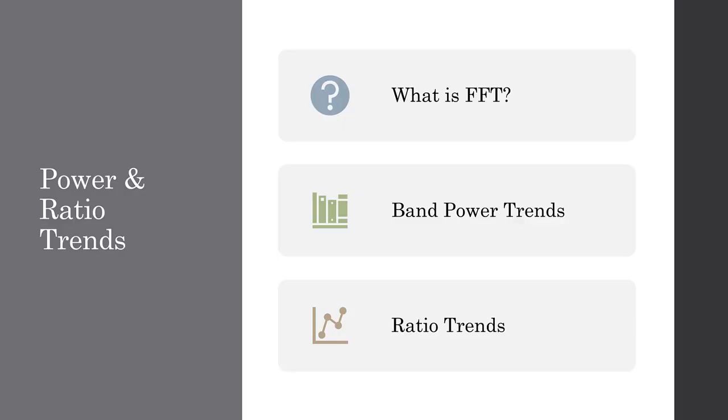Now let's move on to frequency-based trends. We did look at some amplitude trends that were bounded by frequency, AEEG 2 to 20 hertz, using an asymmetric filter, which just means it's not a flat filter. It attenuates some frequencies more than others within that 2 to 20 hertz range. There are details of that in the user guide, and of course you can always meet by web conference.